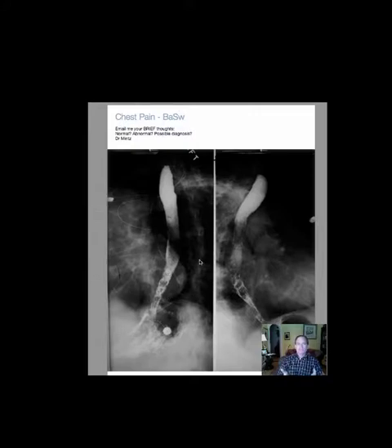But it's not so much this particular case and trying to describe it completely and fully. That's not what I'm looking for. I just want to see what terms you use. And in this case, I would say there's poor filling of the distal esophagus with irregular margins, and the areas of poor filling could be related to mucosal edema that's effacing a part of the esophageal lumen.